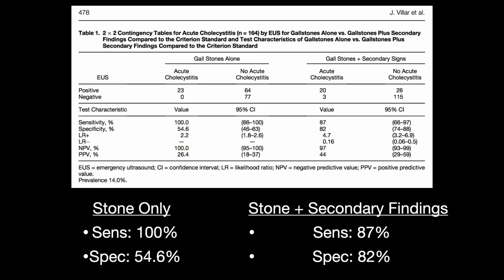And so the way I interpret this paper is, if the patient has right upper quadrant pain and you scan them and they have a clean, super clean, absolutely normal gallbladder, right? Normal wall, no distension, no pericholecystic fluid, doesn't hurt over top the gallbladder, and there's no stones, this is not your patient with cholecystitis, right?